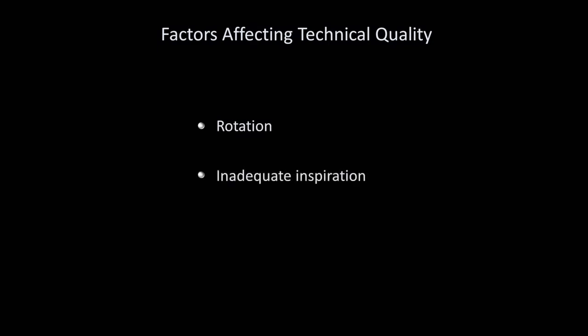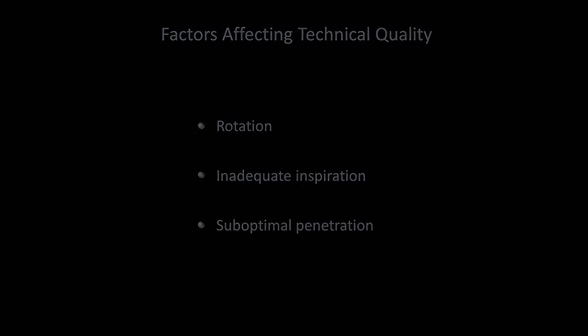So what are the specific factors affecting technical quality? They are rotation of the patient, inadequate inspiration, and suboptimal penetration. I'll review each one at a time.